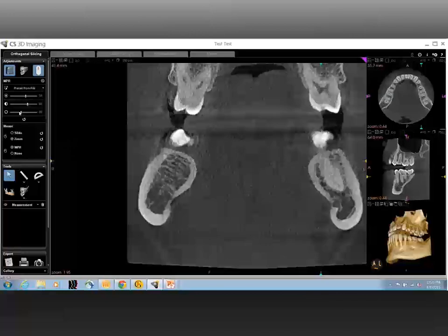Thank you very much. And I think I should have introduced this as being a cursory overview of the mandible. This is not a full radiology read. We're looking with the Carestream University to do short videos that cover important areas critical to cone beam CT, but to do them in brief online presentations. So in summary of what you were saying, number one was integrity of the cortical bone. Number two was structure of the cancellous bone. And number three was the trabeculation pattern. What other anatomical structures, if any, do you focus in on?